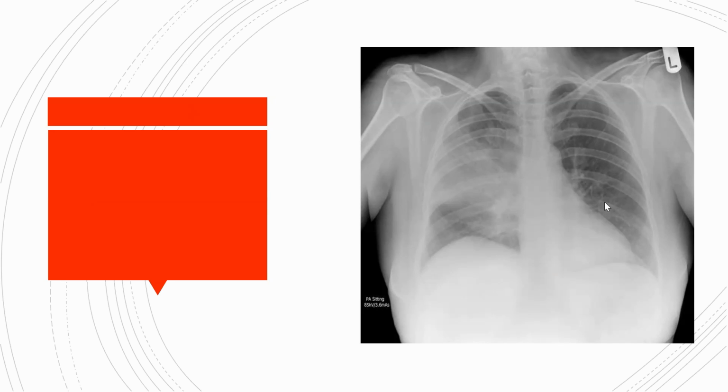So I think it's a bit underpenetrated at the beginning. It's very white, isn't it? So it might be a bit difficult, but I can see the lung markings up to the edge. So I'm quite happy here that the lung markings are extending up to the edge. Someone said, yeah, I'll give you guys a bit more time.